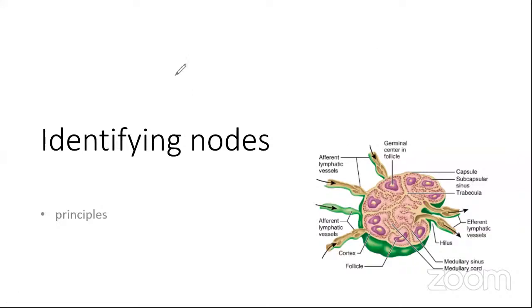Let me just annotate this structure to have an idea. So this is the one. So this is the short axis diameter, whereas this part is going to be the long axis diameter. I hope everyone is able to see. So the short diameter, traditionally we say if it is more than 1 centimeter, I'm writing using a mouse, so it becomes very ugly, but you can get the concept of it. So the short axis diameter more than 1 centimeter, we call that a significant node, and that's what we do in most of the nodes in different parts of the body.